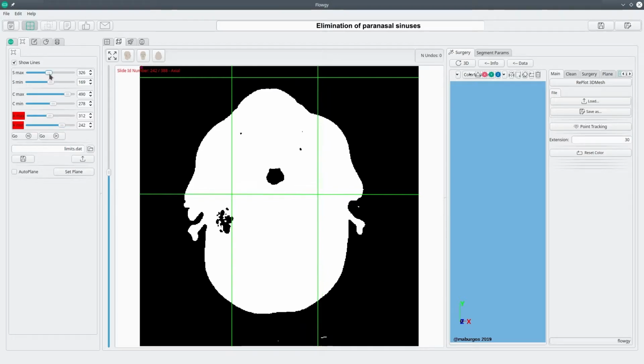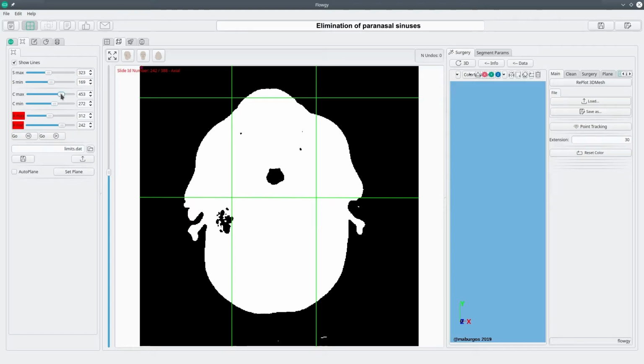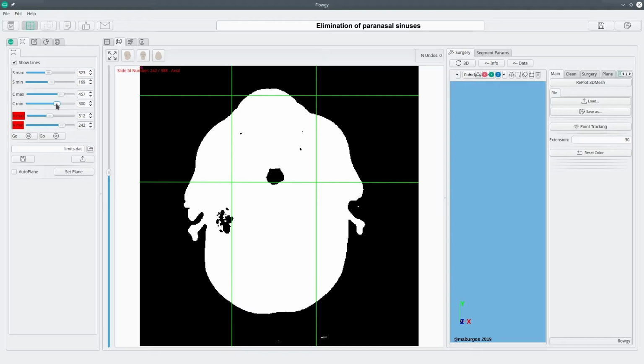I will just adjust our bounding box a little bit better and make this down here and there. Also, it is not that important if you cut a sinew here. It will still be processed afterwards. After we have set an area that we want as our bounding box, we go back to our workflow page and select the Recognize button.